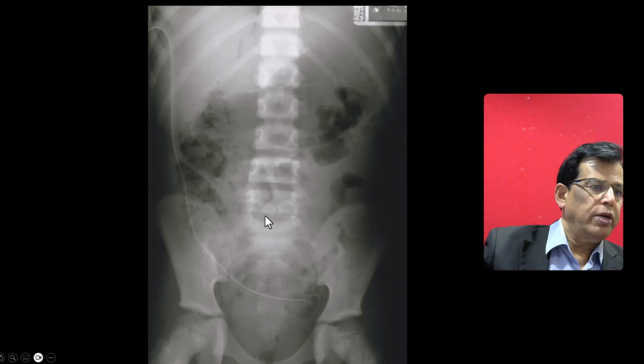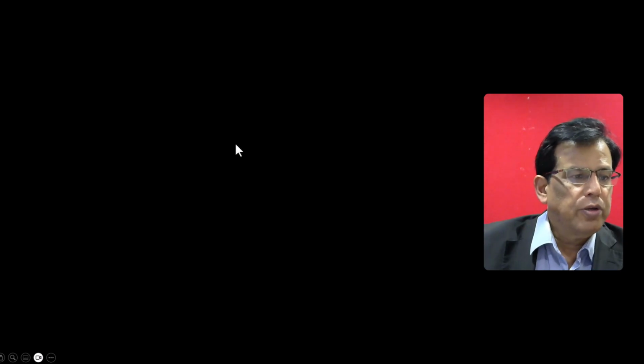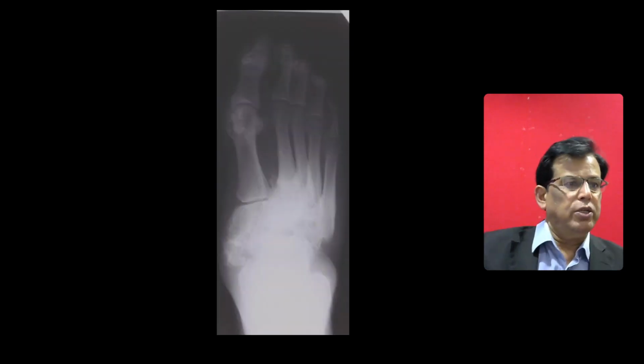The bowel is okay. Bones are sclerotic. In exam, try to join all the findings. So you were able to join this with this, and it is renal osteodystrophy, Rugger Jersey spine. Very good. Did very well. This is, I think you worked out.